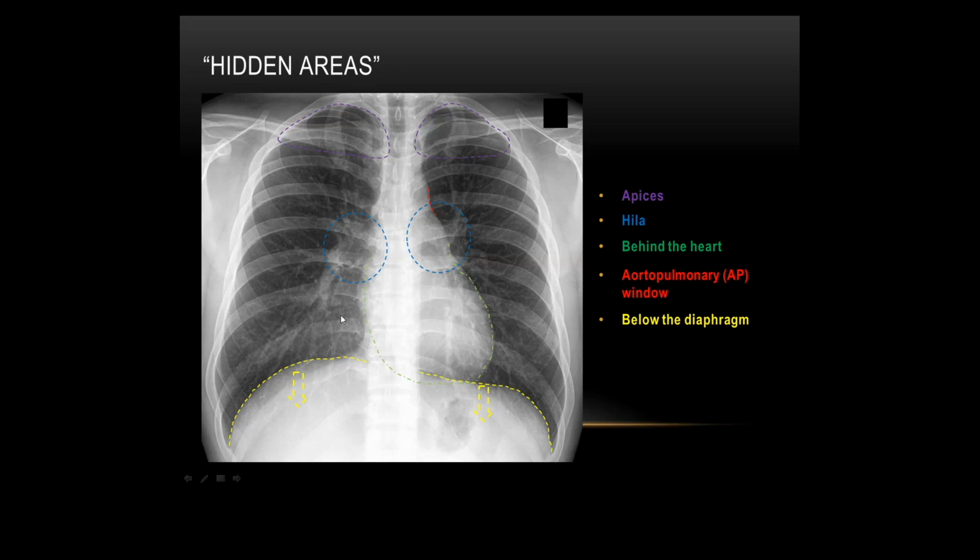The patient had a chest X-ray 6 months later, and I just saw this getting bigger and bigger. So it was actually a tumour that originated right down in this lung base, and as it was growing, it started peeking above the diaphragm a little bit. So it is a good area to look, but it can be very tricky, again particularly for patients who haven't taken a good breath in. So can you see how you need a good chest X-ray to get any sort of reliable diagnosis out of it? So, going back to the aortopulmonary window here, I'll just draw this one for you.